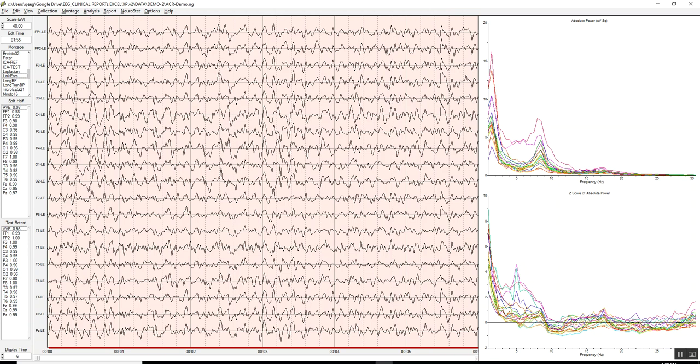You move your mouse or your cursor to the label on the left here, and I right mouse click, and it shows you the problem areas you're predicting will be deviant from normal. So I'm going through here to identify those likely Brodmann areas. That way you can form hypotheses prior to launching Loretta or launching SW Loretta or the Navigator, and avoid multiple comparison issues.